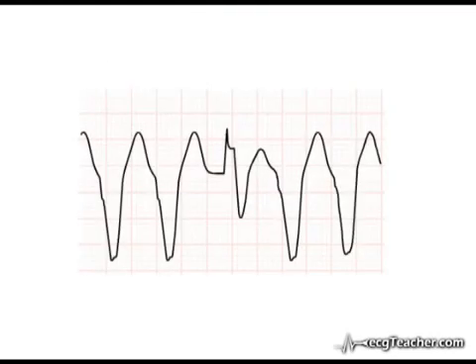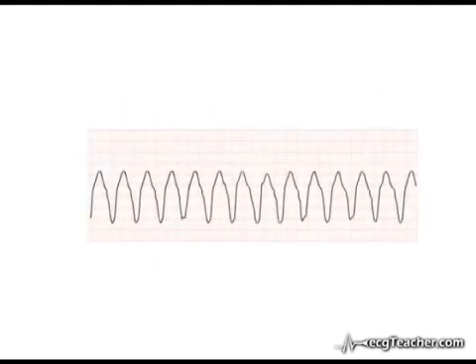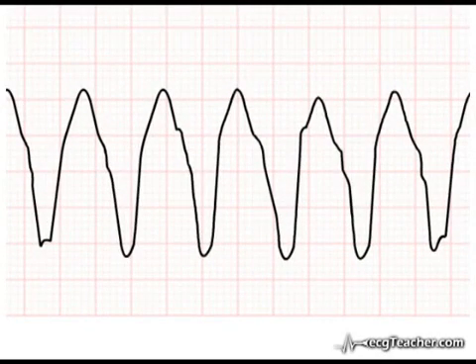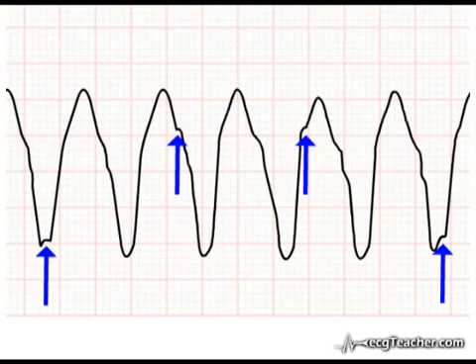To identify a fusion complex, we look for a QRS complex which differs in morphology from the surrounding complexes of the tachyarrhythmia, and which shares features of both the normal and broad QRS complexes. Like the complexes of the tachycardia, a fusion beat is bizarre in morphology, but bizarre in a different way. Although not obvious in our patient, with experience it is possible in many cases to identify P-wave activity fused with the components of the broad complex tachycardia of VT.